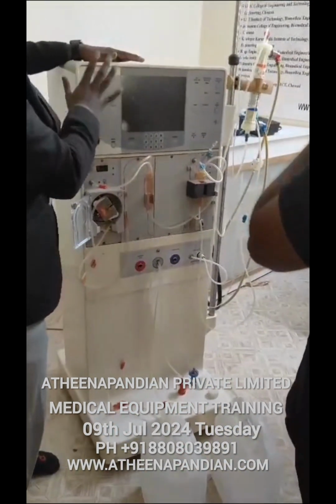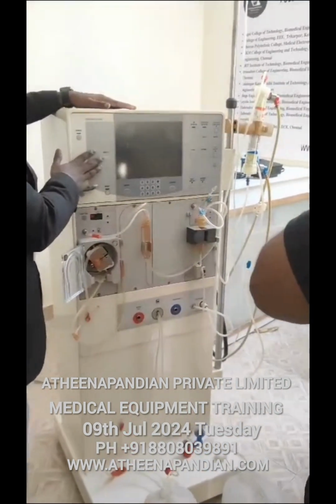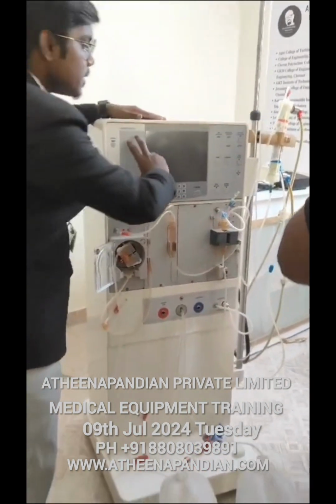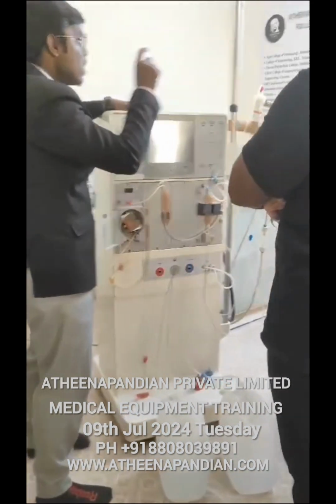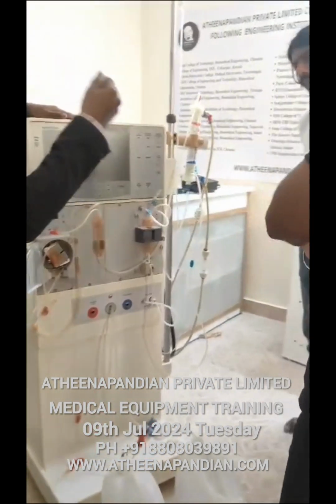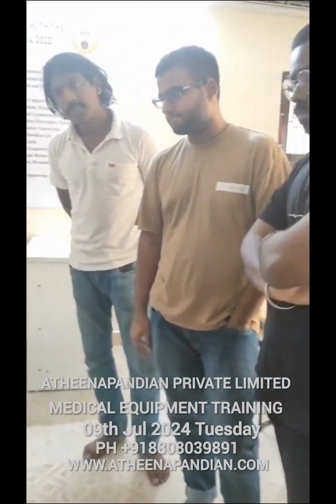So the calibration is done once before you turn on the machine. The calibration is the most important. Why is the calibration most important? Because it automatically senses all the sensors: whether the flow sensing is correct or not, whether the air bubble detector is correct or not, whether the temperature detector is correct or not. It will be shown on the display before the morning.